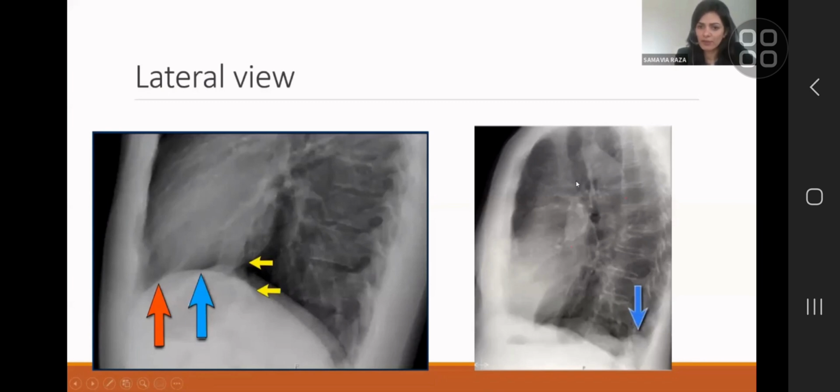If you can't see it, it's still okay. The arch of the aorta is more commonly seen. It's sometimes clear, sometimes not that clear. It's still okay. Historically, if you look up the literature, somebody will have written a paper saying this hilum is higher than the other on the lateral view, and this is the right and this is the left. That doesn't play into much effect anymore. So I wouldn't focus too much on the landmarks on the lateral view. It is what is normal and abnormal.